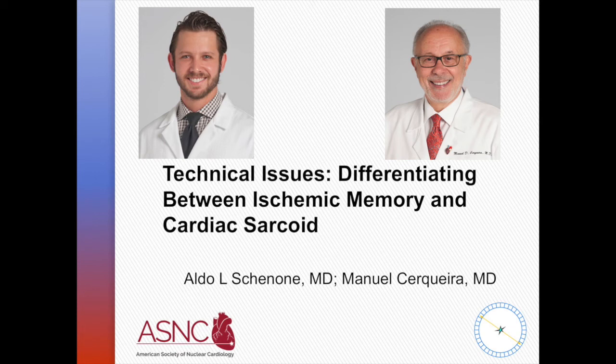And we're going to be talking about technical issues, differentiating between ischemic memory and cardiac sarcoid using PET imaging. And Aldo, if you present the first case. Absolutely. It will be my pleasure to present this case.